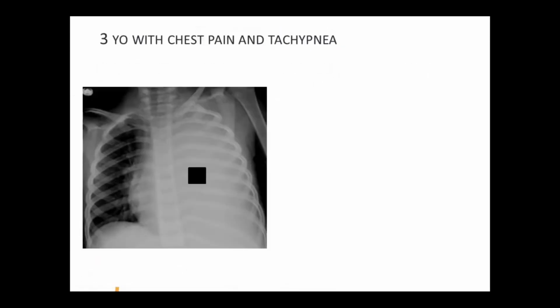Phew, it's been a long day. It's about time for lunch in your clinic, so feel free to chow down on some food while we go over the next patient's chest film. We're approximately at the halfway mark. While you grab a bite, let's look at our next patient.